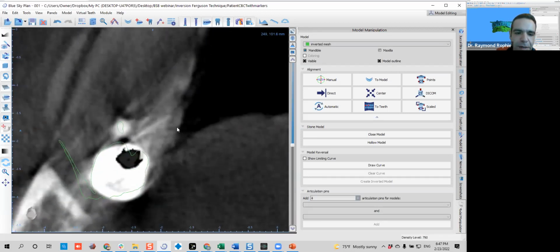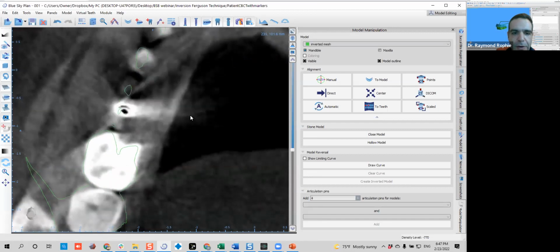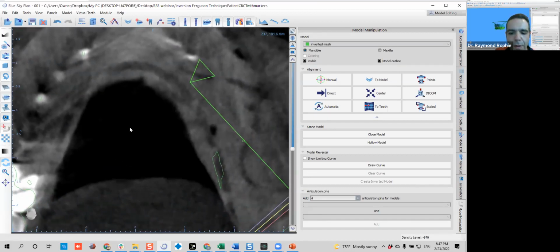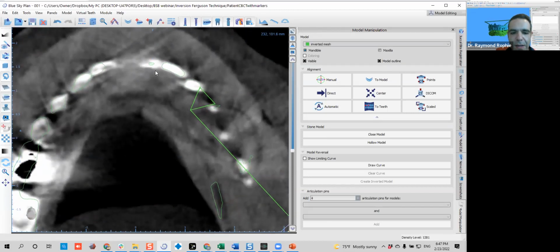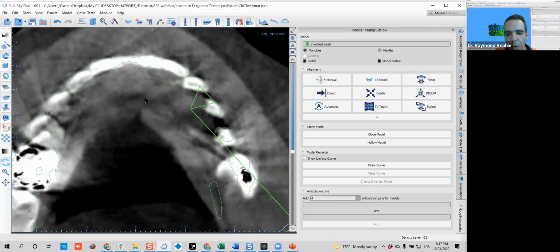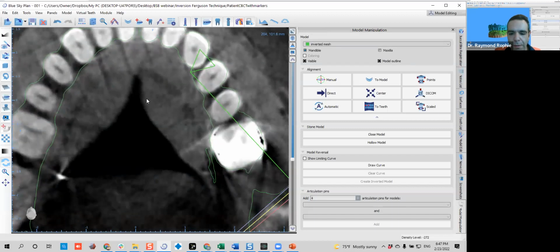This is difficult because it is metal. However, if you have natural teeth, you will start seeing the same pattern all over the model. Okay, so what you want to see at least is that the very first tips of the model comply or align, stitch perfectly, and all the rest looks good. Okay, so this will work.